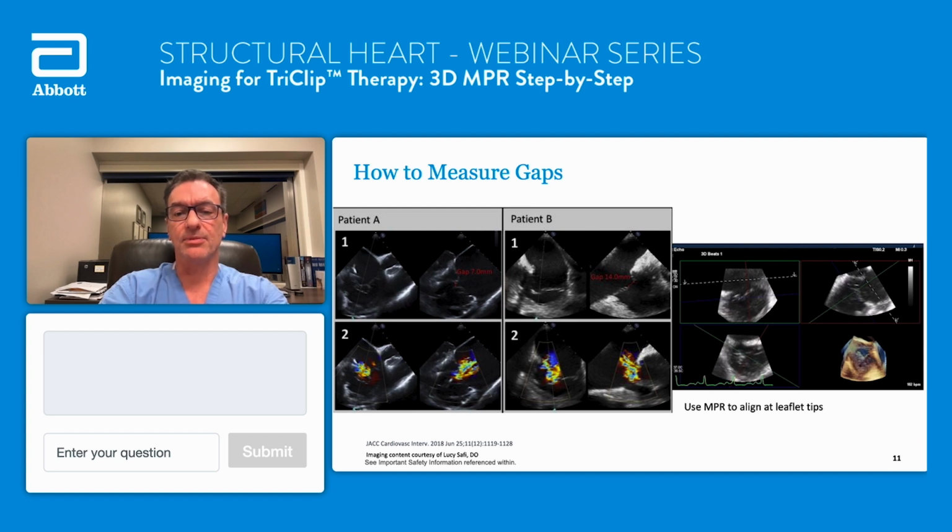And then finally, an MPR shown on the right, and Dr. Safi is going to take us through this in a moment. How do we set this up? How do we use this? And aligning at the leaflet tip. Sometimes it's obvious on an X-plane view, but sometimes MPR can be very helpful to be confident that you're truly at where the gap is and where you're going to be deploying the device potentially. And that's a very useful tool for measuring gaps.